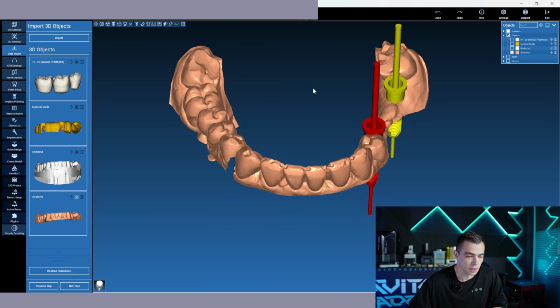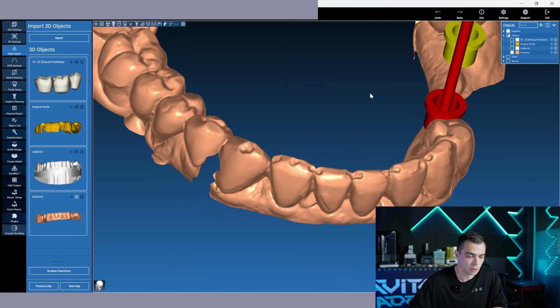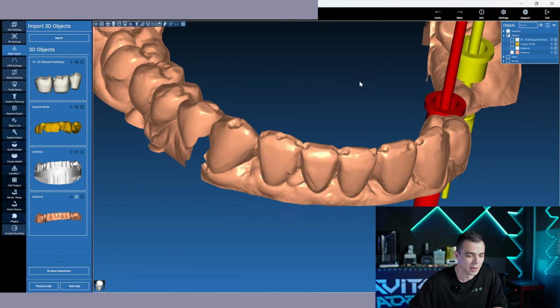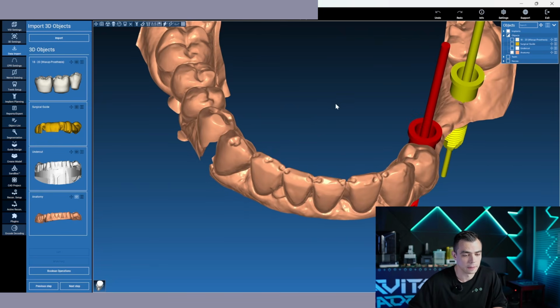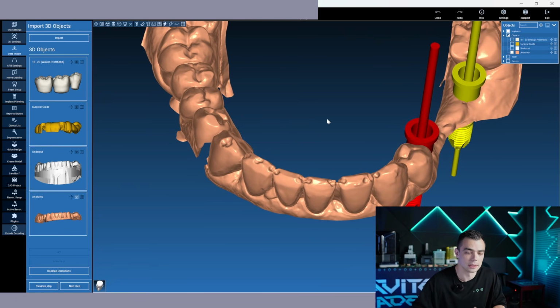So in this video, in this case, we have such a model. Of course, it's prepared, but this scan contains the most common mistakes you can face, and we as dental practitioners have to know how to deal with such issues.